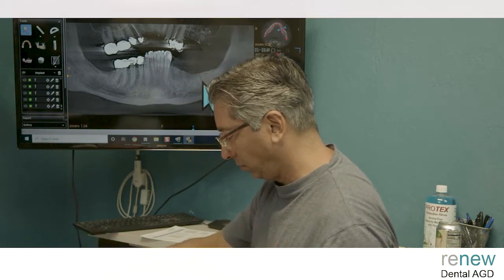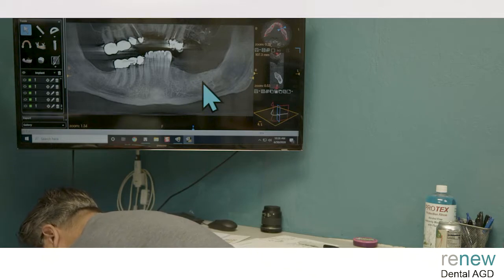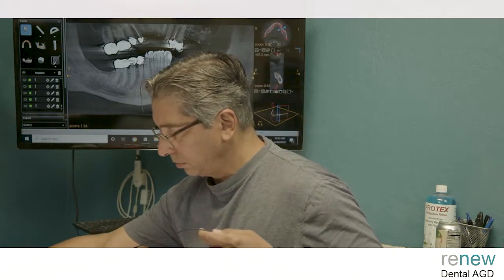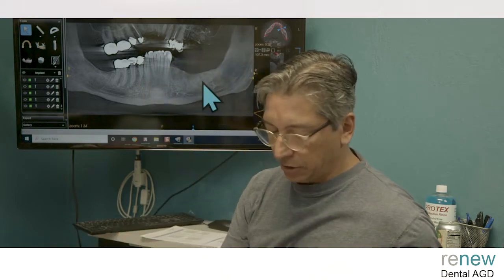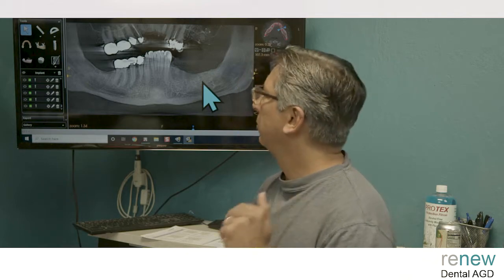That's a problem. Vince, you're going to have to try to edit this through. So I'm going to go back to tooth numbers. I'm going to start over again. All right, so maybe I'll capture this again.